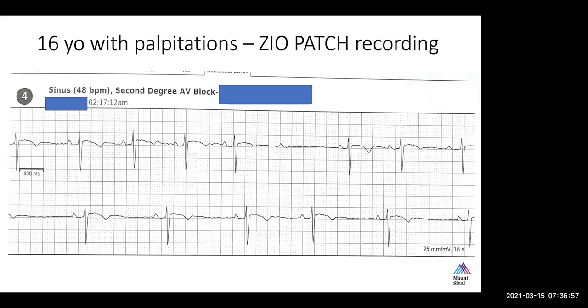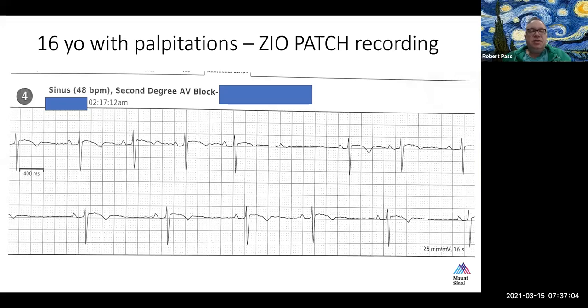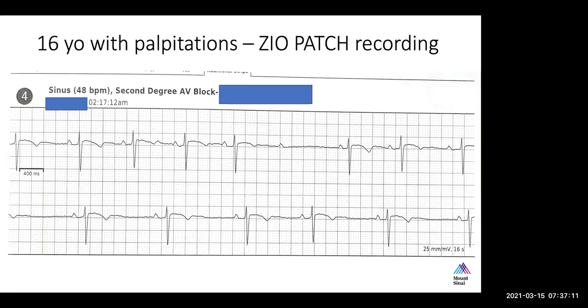Yeah, I mean, it looks like a Wenckebach. But it's just, yeah, one beat. Right. So is this a concerning finding? Note that this is recorded at 2:17 a.m. No, it's not concerning. People can Wenckebach while sleeping.